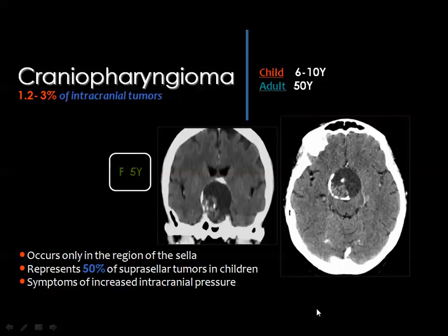The tumor is almost a midline tumor occurring in the suprasellar area. And for the diagnosis of the craniopharyngioma, we should have three main findings. Number one is the cystic component. Number two is solid component. Number three, calcium. Then if you see the three components in a child or in an adult in the midline, you may be able to diagnose the possibility of craniopharyngioma.